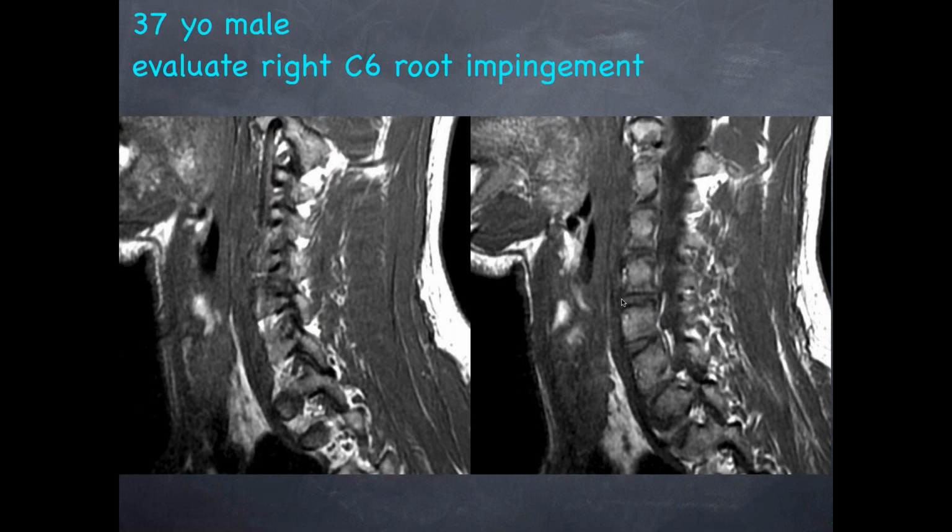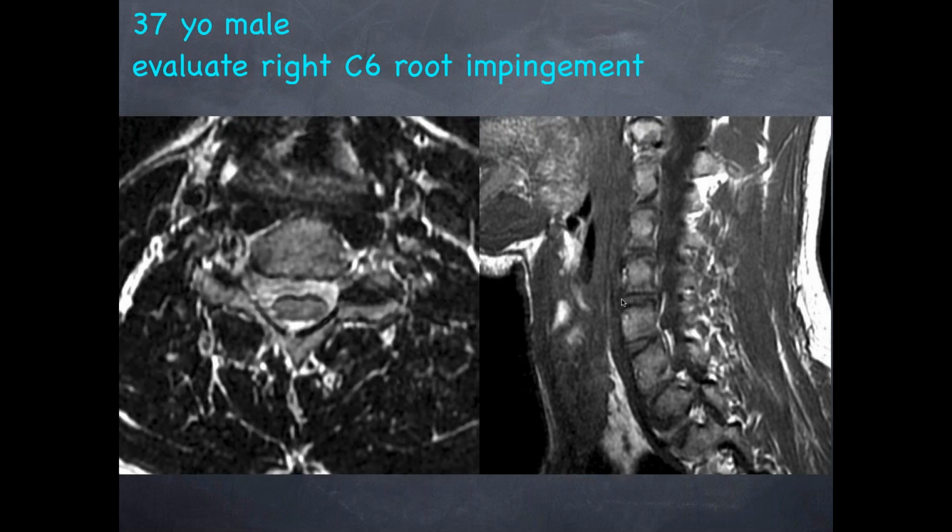Okay. Hamid, what do you think of this one? Okay, so on to sagittal images. I'm not sure I see anything here. Yeah. Just that change.